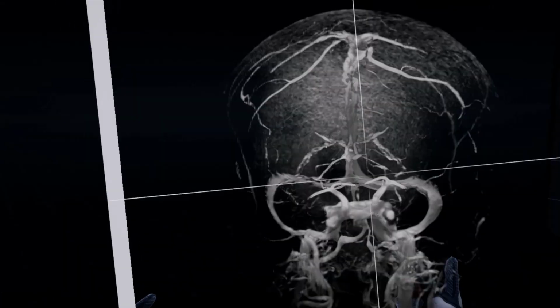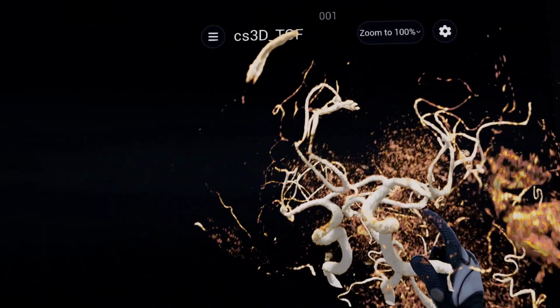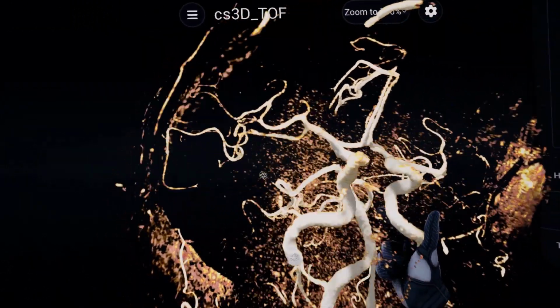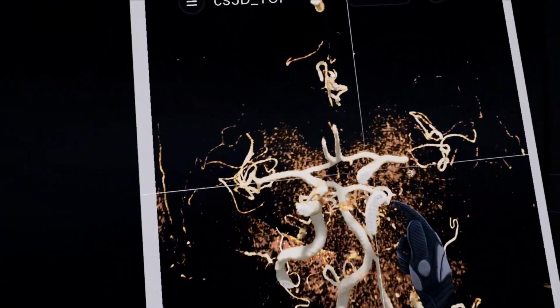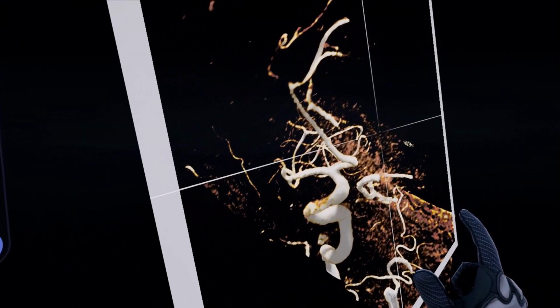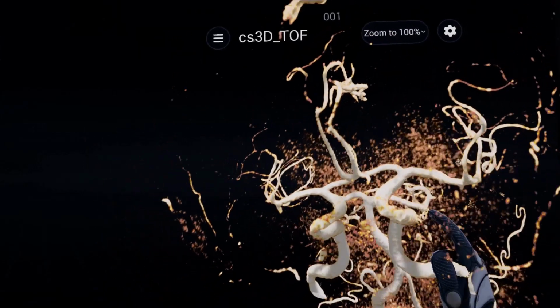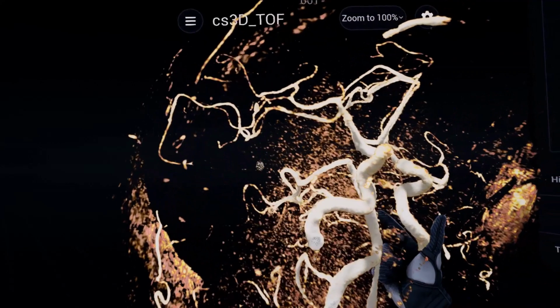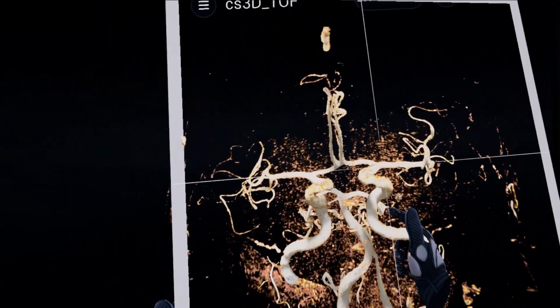vessels. Non-contrast-enhanced time-of-flight magnetic resonance arteriography is the best pulse sequence to assess arterial vessels of the brain, the so-called circle of Willis, and exclude its aneurysms. High spatial resolution, about 0.6 mm, and shaded surface display, SSD, post-processing allow accurate delineation and visual separation of vascular structures from other brain tissues.